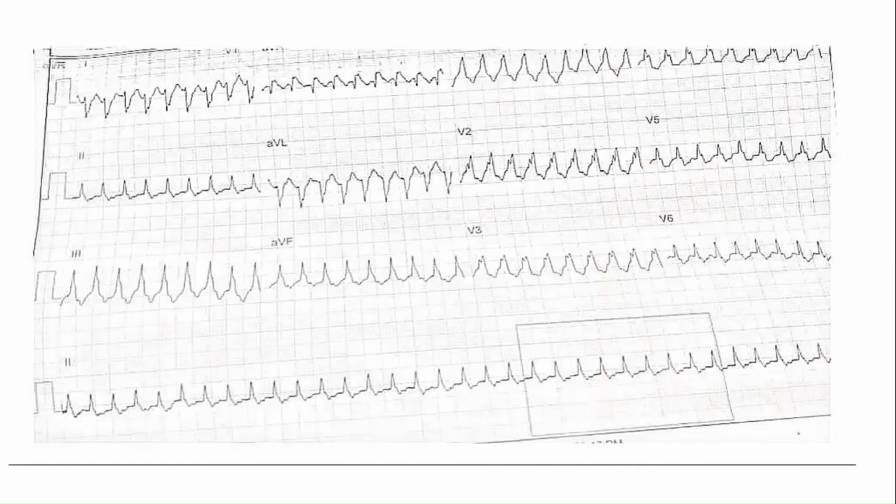Because this ECG might come, you have to differentiate SVT with aberrancy from VT. Yes, this is a thing which occurs in exams. No VT, sir. It looks like SVT. Now look at lead V2, you will see the deflections there. It looks like a P wave. Yes, V2, regularly coming. And look at limb lead 2, and limb lead 3. It's more obvious over here.